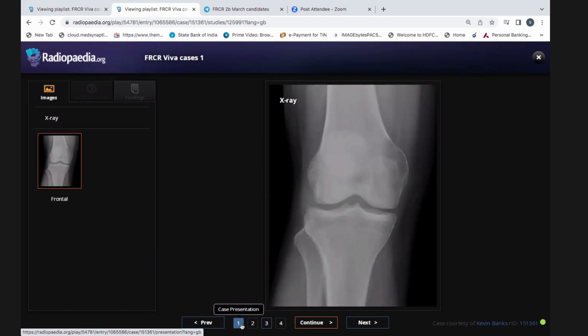Frontal radiographs of the same patient, which correlate with the avid uptake. No definite bony fracture could be detected.